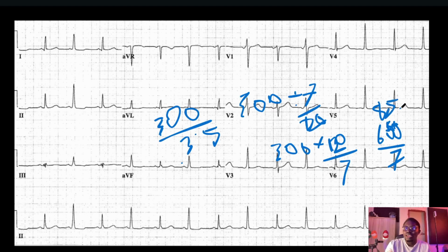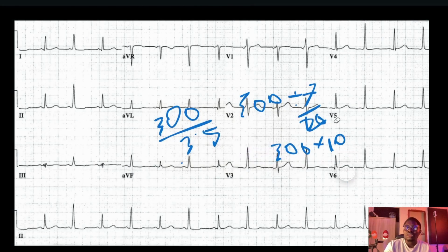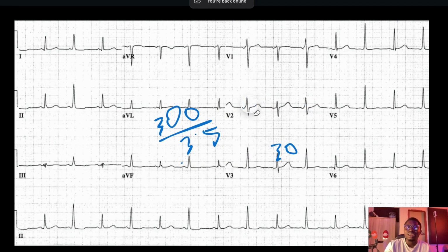Good. So it's 85 point something, approximately 85 beats per minute. Sorry, I took the long route, but this could be a lesson in mathematics.